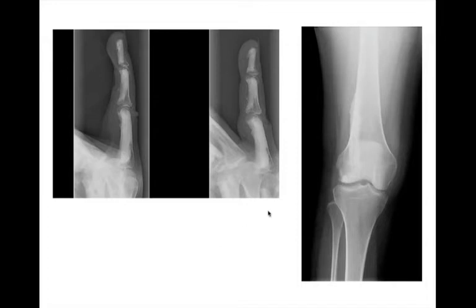Okay, so here we have our classic dripping candle wax on the femur, right, running along here, and there's also this diffuse sclerosis involving the finger. So this was a case of melorheostosis. This is the classic description, the classic dripping candle wax, and this is not as classic of an appearance, but this was the same patient. This kind of sclerosis, this dysplasia along the sclerotome. This is melorheostosis.